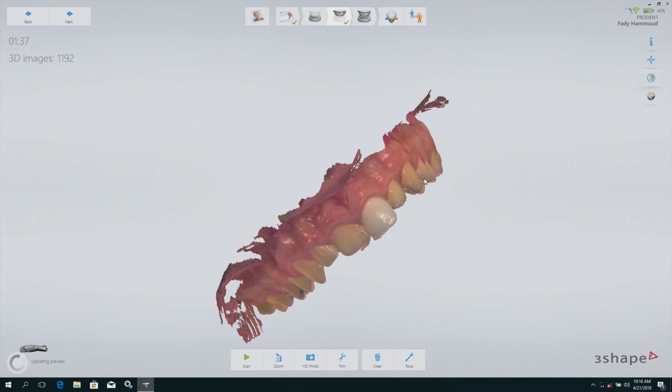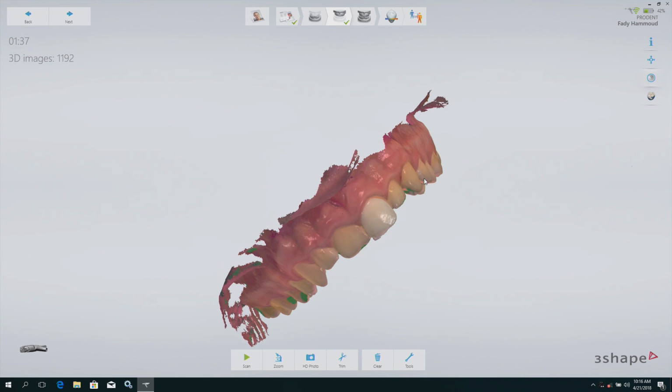It will be different thickness in different teeth, depending on the arch. For example, on one tooth it will be 0.5 millimeter, on another almost 0. So it's mostly how high you want the teeth to be. Yes, right. Okay, thank you.